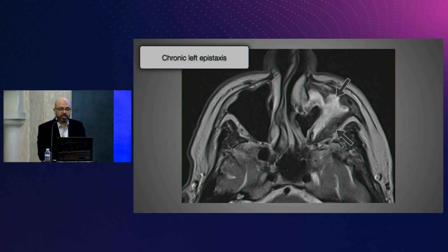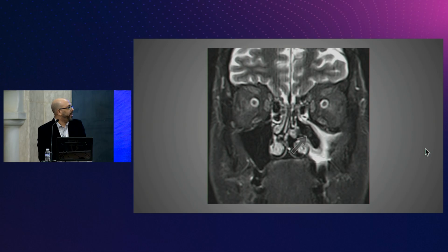Is this just gas, or is it something else? Okay, so here, can you see that? There's a ghost of something, a shadow. But you can't make a definite diagnosis. It could be just some artifact, right?